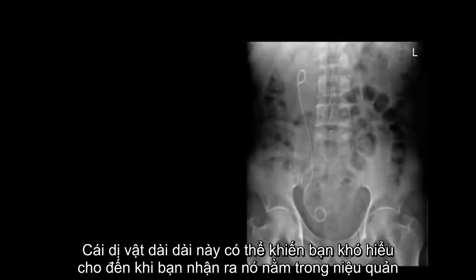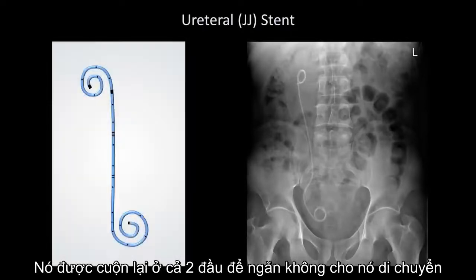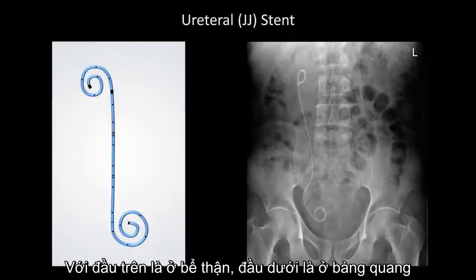This elongated foreign body might be puzzling until you realize that it's within the ureter. This is a ureteral stent, also called a double J or JJ stent. It's coiled at both ends to prevent migration, with the upper coil within the renal pelvis and the lower coil within the bladder.